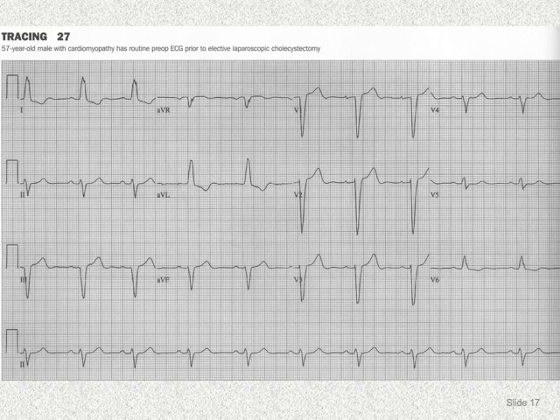In regular interpretation, as we see here, the P wave is upright in lead 1 and lead 2, and each P wave is followed by a QRS complex, so this is sinus rhythm. We see here an R-R interval of around 4 to 5 squares, so the rate is around 60 to 75, which is normal and regular, so this is normal sinus rhythm.